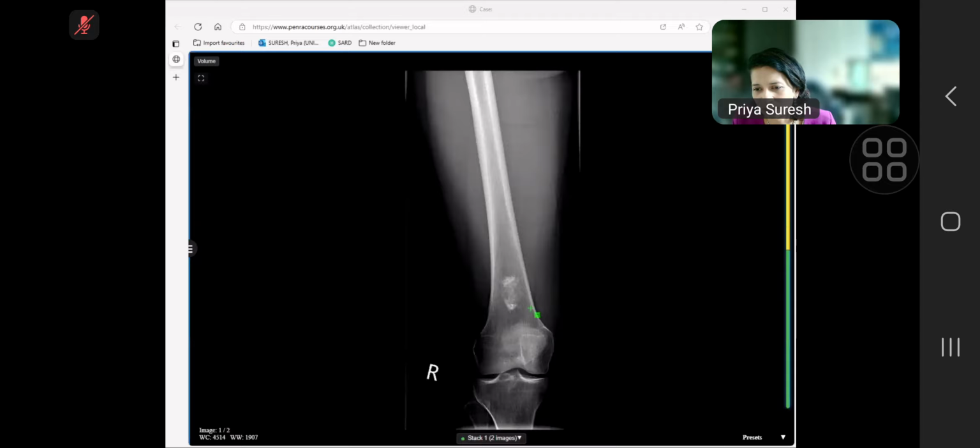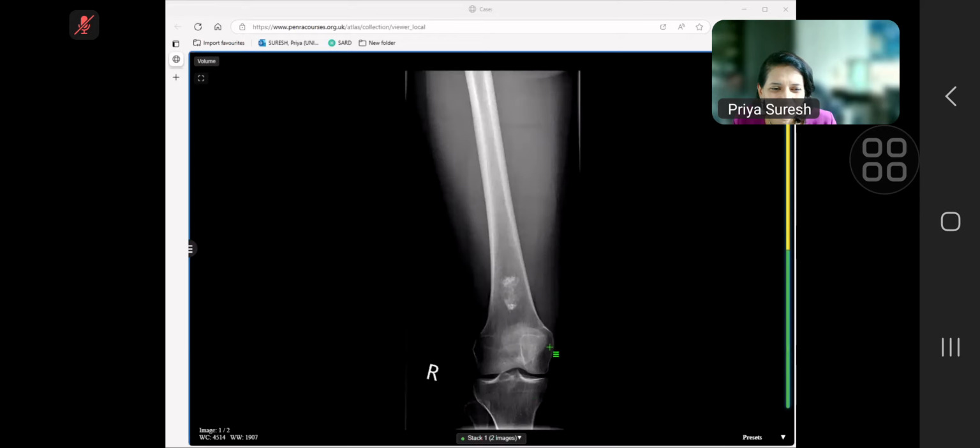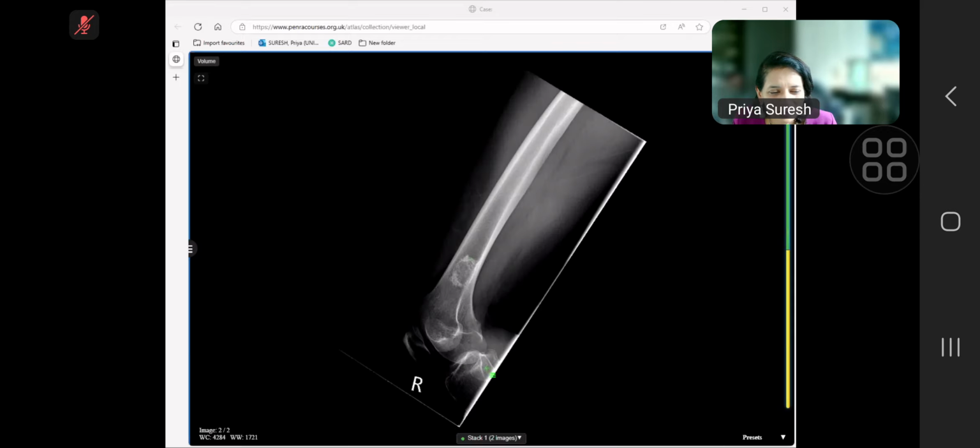Yeah, this was very well done. So, Enchondroma. Again, I asked, is there anything else you want to do? You didn't ask for the second view. So you have to ask. That is your homework: make a note, ask for the second view. But that is again very well done.